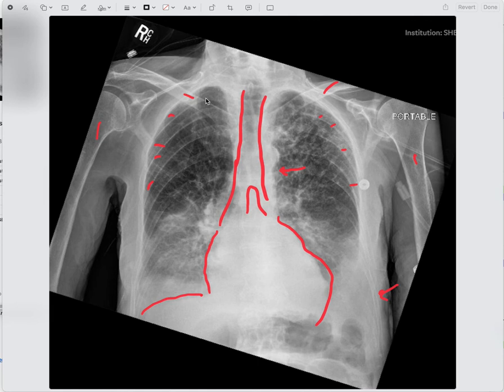so you look down here, back down the diaphragms, and you can see that this is pretty much gone with that white fluffy stuff, and here's some more here as well. You have a bunch up here, more so on the left side, a little bit in the right, but it's more infiltrates on the left-hand side there. And you also have infiltrate here, and it looks like a smaller pleural effusion here.